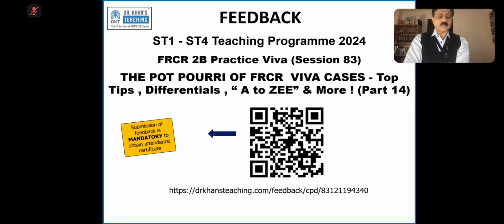So cavernoma versus amyloid angiopathy, these patients are usually 60 or 60 plus. These patients will have white matter abnormality, small vessel ischemia type of findings. And our case was absolutely normal, every sequence. There was nothing there. I had not told you the clinical. I should have told you the clinical also, 53-year-old, headache. But so that is why it was not cerebral amyloid angiopathy. In cerebral amyloid angiopathy, you will see white matter changes.